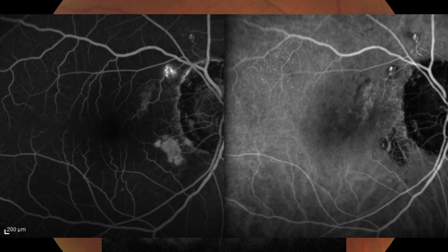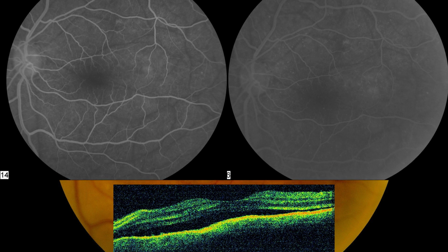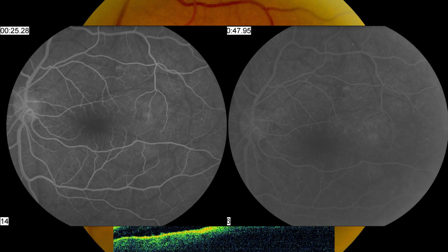So this patient had polypoidal choroidal vasculopathy, I think originally described as posterior uveal bleeding syndrome, and that was described in Philadelphia, I think, by Dr. Klein. And so here we have a patient with retinal striae, subretinal fluid, and some RPE folds. The OCT shows subretinal fluid as well. On the fluorescein angiogram, sorry, I don't have any later images, they kind of washed out. You could see these linear, scattered, hypofluorescent streaks consistent with the chorioretinal folds. And then in the later image at 48 seconds, you could see these multiple pinpoint white dots. That goes along with something called a starry night sky fluorescein angiogram.